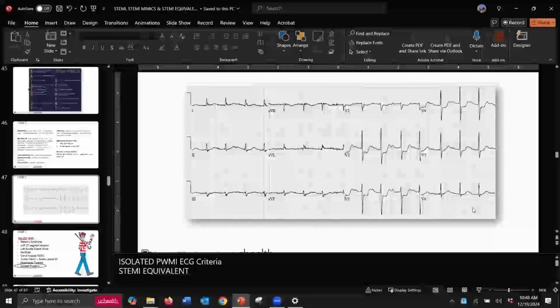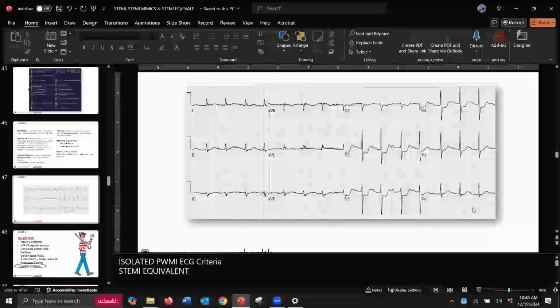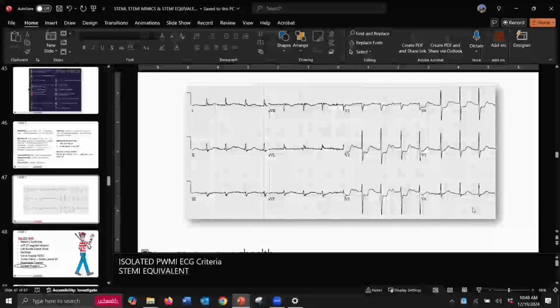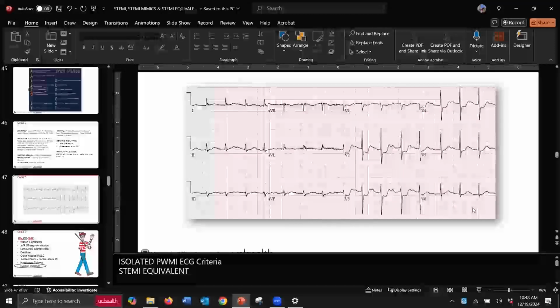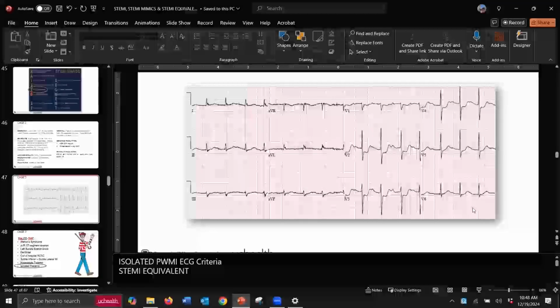Absolutely. Thank you for the non-STEMI. Let's go ahead and get her on the bus and make the wheels on the bus go round and round. Can I have a heparin drip? Yeah, there you go. Pretty please, helicopter, right? Yeah, absolutely. I might ask for it. Boy, if I saw this on the EKG before we left, I might.